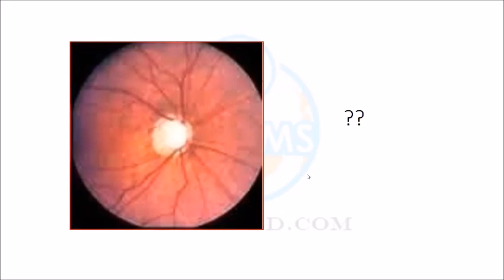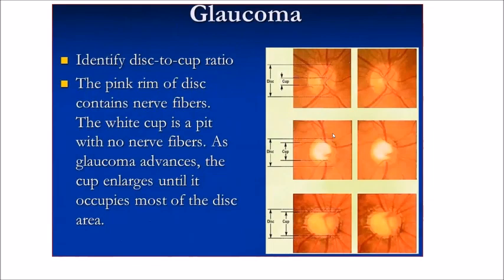Yes, Dr. Mahbub? I am not of the same opinion as Dr. Farial. No, sir. Vessels are not coming from the center. So vessels are pushed apart. Do you agree? Yes. Vessels are pushed apart. That means there is more pressure inside the eyeball. This is the glaucoma.